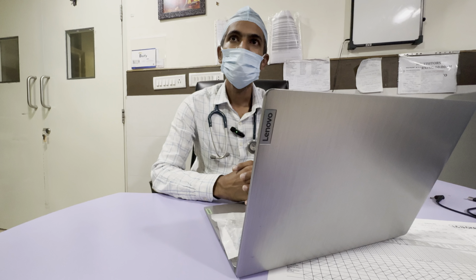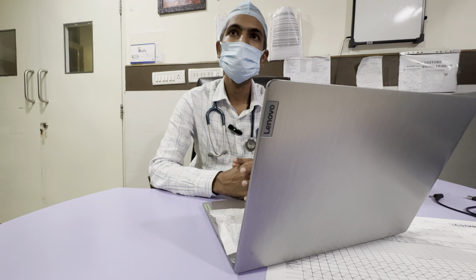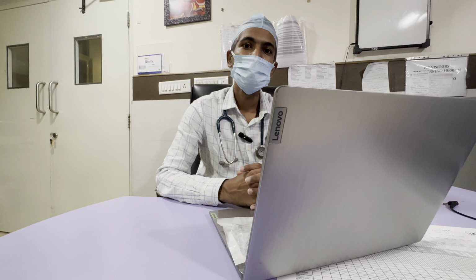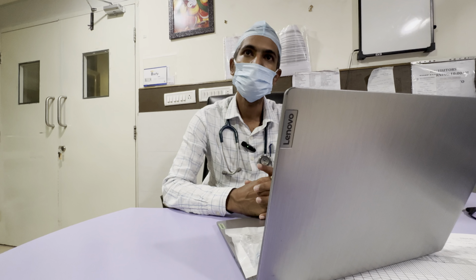Hi, in this series we are going to learn about airway management. So first thing we are going to study is the endotracheal tube. In this session we are going to see what an ET tube is, the parts of an ET tube, and how it is to be used.